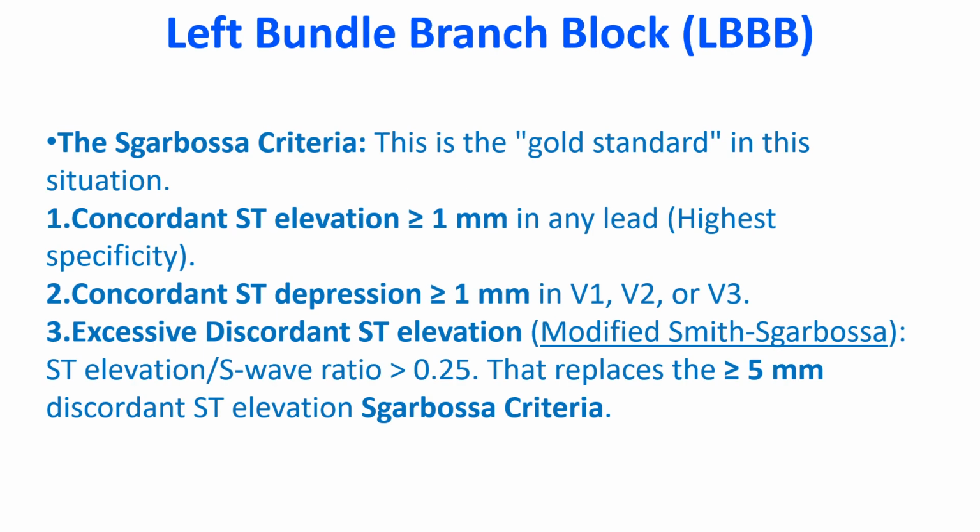Though a new LBBB was thought of as a STEMI equivalent, many LBBBs are chronic. That's when the Sgarbossa criteria, which is considered the gold standard in this situation, come in. Concordant ST elevation of 1 or more millimeter in any lead has a high specificity.